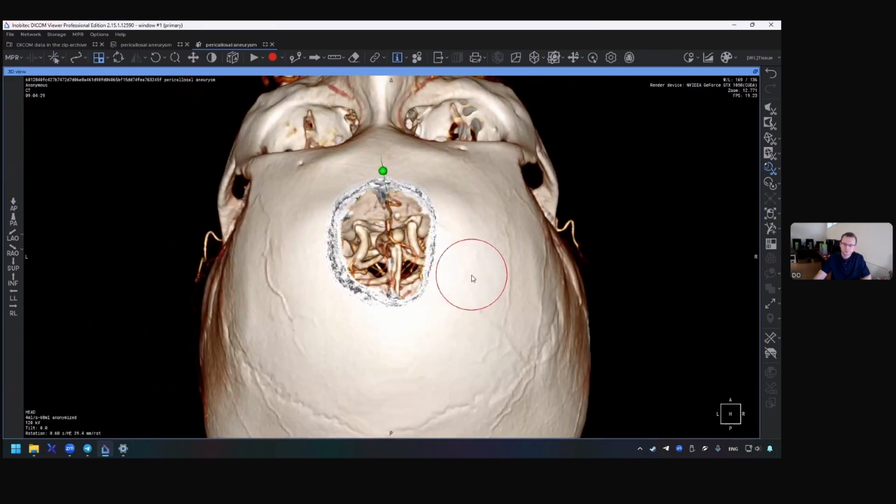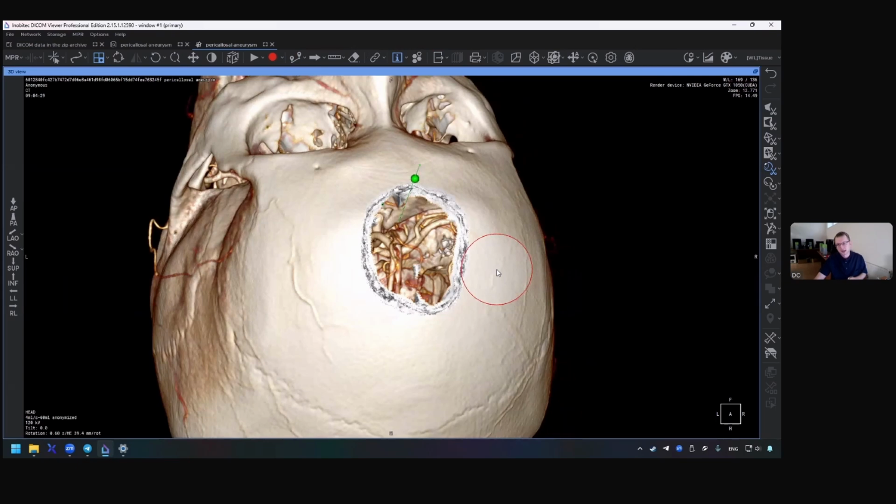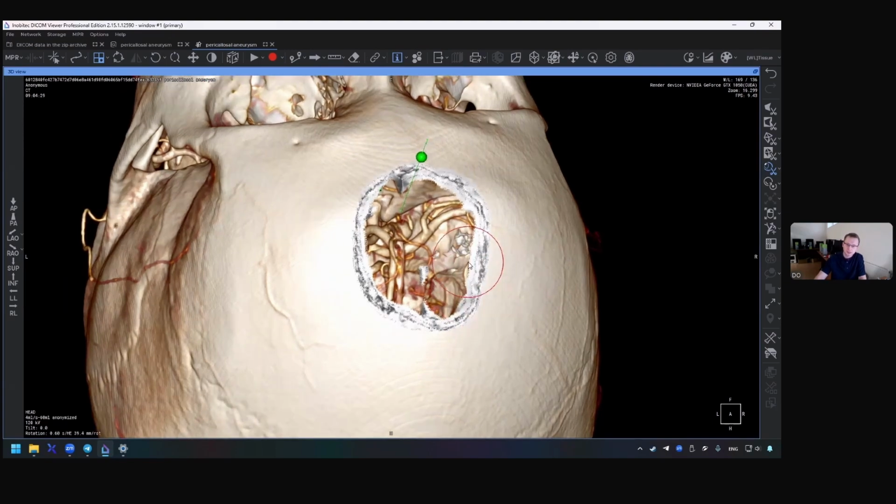It is very helpful. And after some time, when we used Inobitec software, we learned about the segmentation and started using it. With segmentation, you can make a very accurate 2D and 3D representation of individual anatomy. And I have several cases for you.